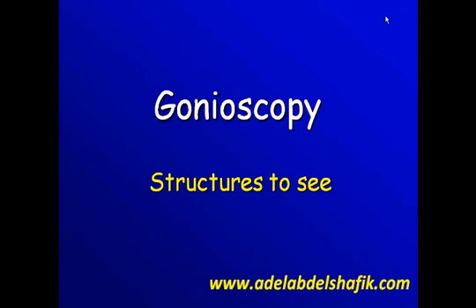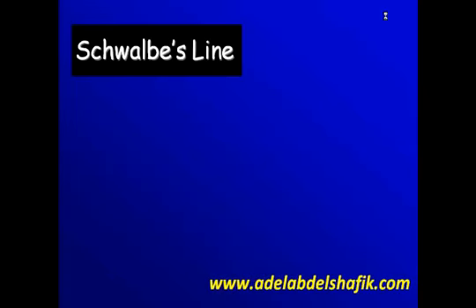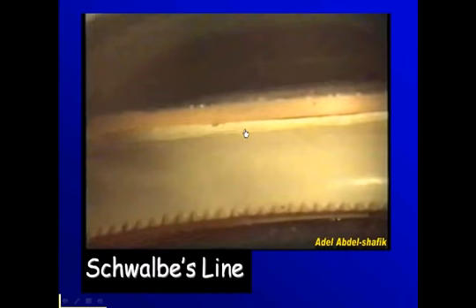Now, what are the structures to be seen? First, the most important, you need to identify Schwalbe's line. This is a model of the eyeball, the plastic model, and I put it on a slit lamp, and I get this video. You see here, this is the iris. The reddish part is the ciliary body, and this is the trabecular meshwork. This is the scleral spur, and we get here the Schwalbe's line.